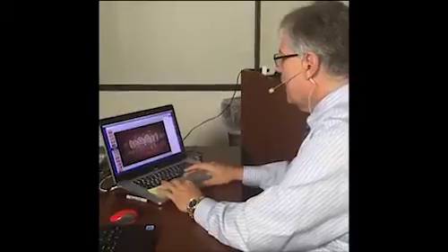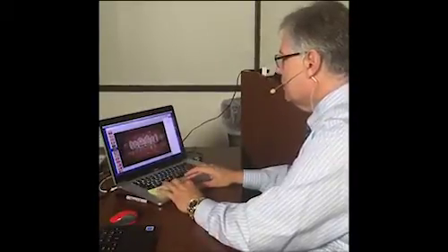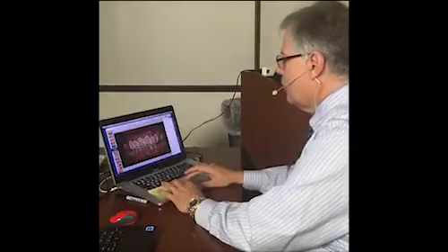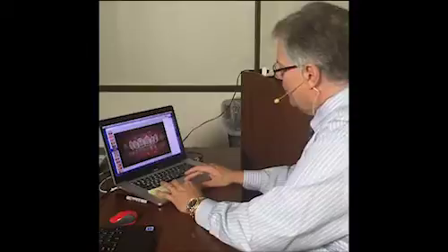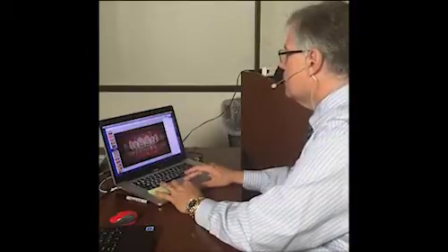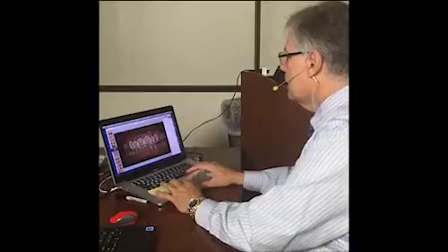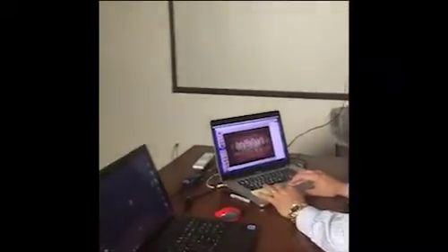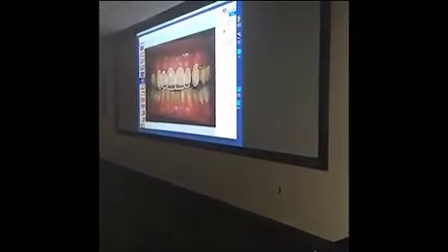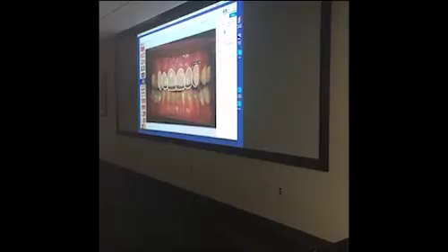So what I would do now is I put the incisal edge where I'd like. If I click off of these, I can now individually size them. If I grab a corner, it will let me move like this. By the way, exactly the same in both formats. I put the gingival margin where the gingiva is. Okay? So in this case, actually, I was pretty close to where the teeth are. Gingival margins are right kind of here. I can move one out, come here. You all get the idea? This is not about precision. It's actually about getting an idea.